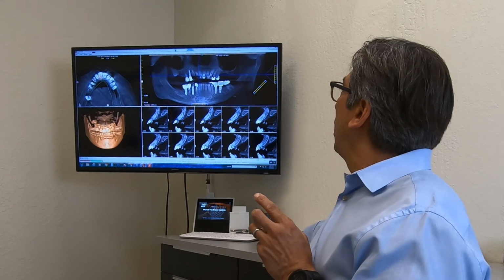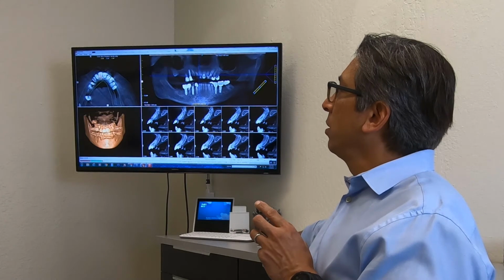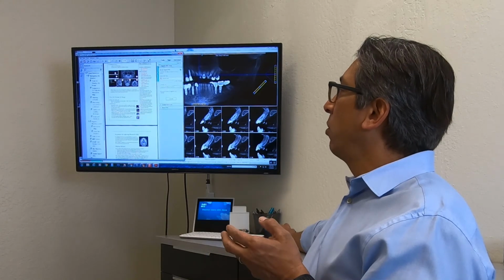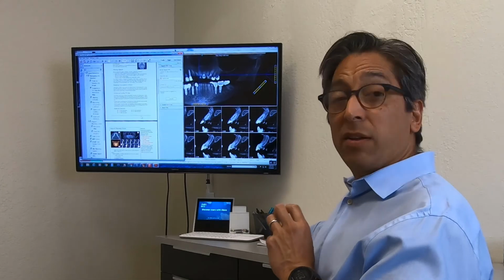It's pretty quick. You can read the tutorial, like we said, up here in the help menu. The quick reference guide will basically show you everything you want to know about what I just explained and even more. It's a simple PDF file and it explains each of those windows. But that'll get you started.